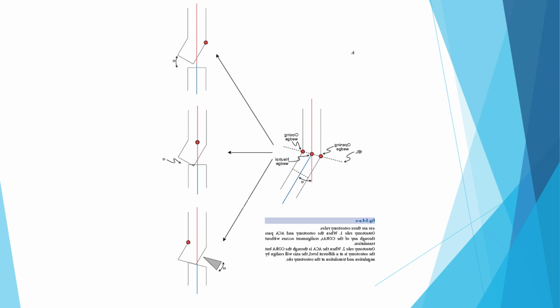So basically we have a deformity here, and we said you cannot put it on the concave side. If you're putting a frame, you have to put it on the convex side, and we have been putting it on the convex side here, and we see how we ended with a straight bone but translation. Now we will put it, despite our osteotomy here, our correction point would be here, as we saw in the last example, where we put the proximal reference point and the distal reference point in this area here.